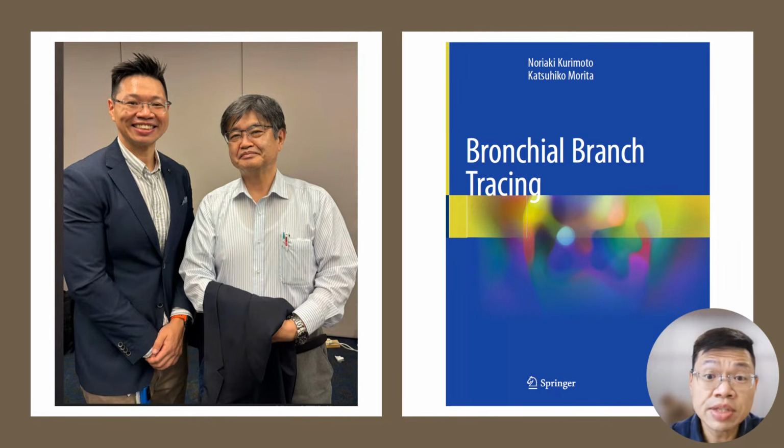Now, I would be remiss not to mention the original inventor of the bronchial branch tracing technique, Professor Noriaki Kurimoto. I would strongly recommend all of you to read his book on bronchial branch tracing. The method I described in this video requires use of the axial, sagittal, and coronal reconstructions, which is a modified version of its original technique of using axial CT views.